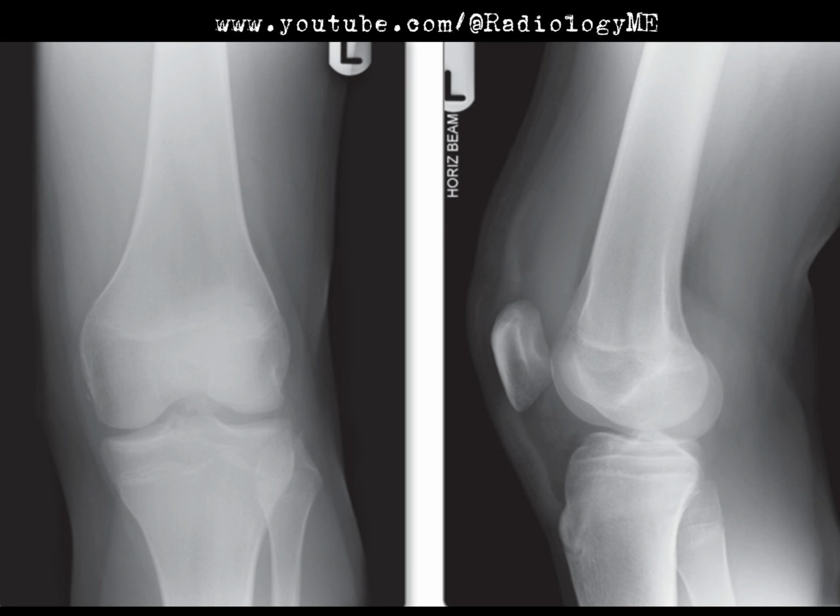Okay, so here we've got a couple of radiographs of the left knee in a skeletally immature patient. We're looking at both frontal and lateral views. And right off the bat, there are a few key things that jump out. First, there's a clear lipohemarthrosis, which always raises the suspicion of an intra-articular fracture. That finding is pretty important because it essentially confirms that we're dealing with something going on inside the joint.